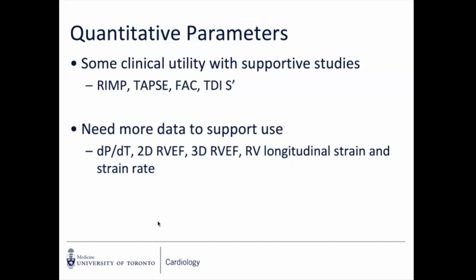For a long time, we actually ignored the RVOT in the parasternal long axis view in that RV piece. We said, yeah, it's not very reliable. It depends on how you image it, but it's actually making a comeback in the European guidelines. So I think getting a standardized, all lined up view is really important for the parasternal. It's a great screening way to look at it. If it's really big, it's really big. And if it's not big, it doesn't eliminate that it's not big in the other views.